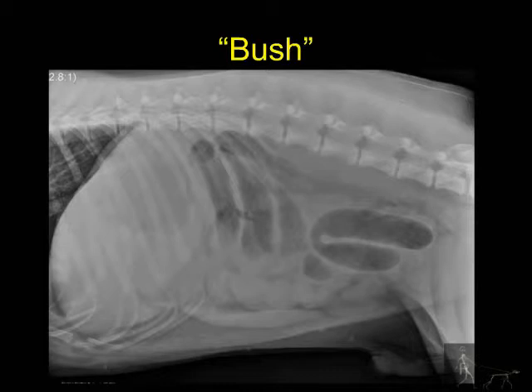No evidence of a radiopaque foreign object is seen, and the remainder of the abdominal organs appear to be normal in size and shape. Also, no definitive evidence of peritoneal fluid or free air accumulation is present.